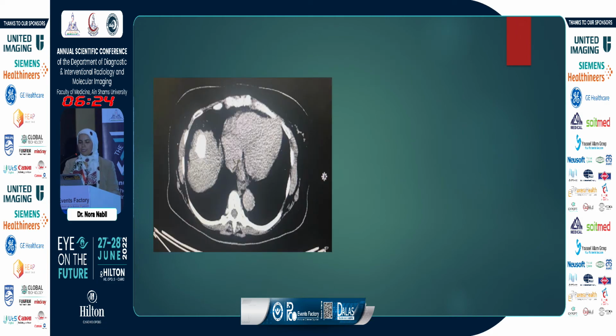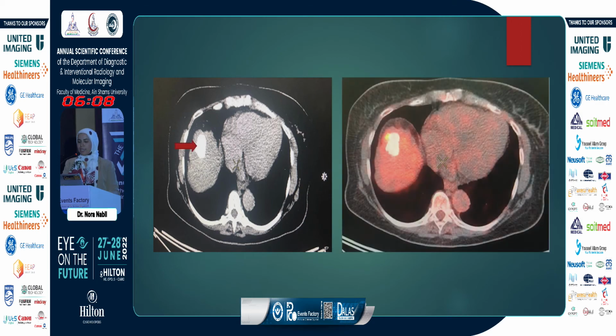of the lipiodol. Here, as we see, the CT non-injected in a male patient due to high serum creatinine level, there is a lipiodol artifact seen at segment 8. We didn't know whether the patient has a residual lesion or recurrent lesion here. When we do the PET examination, here we see a focal intense avidity near the lipiodol, and here we suggest that the management was either incorrect or there is a residual lesion or recurrence according to the duration of the procedures.